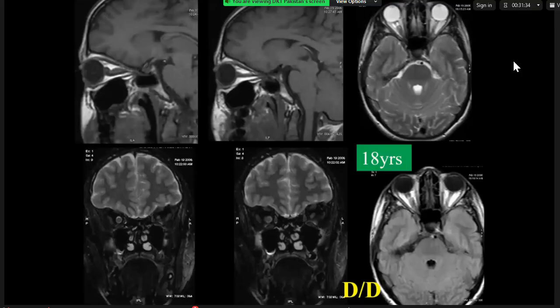Still, because I could see the optic nerve delineated, this still could be meningioma. What else can it be? You know, meningiomas will enhance, right? Yeah. Glioma is less likely because the optic nerve is seen. Could be sarcoid. Other possibilities.